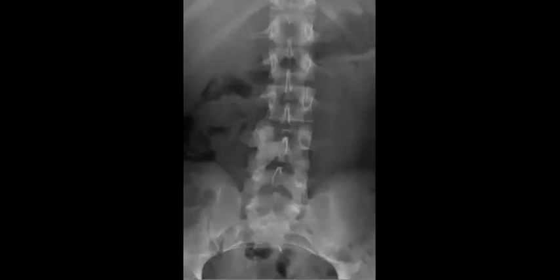Most of the lesions are in the posterior neural arch or posterior elements. So when you see scoliosis and you find this sclerosis, it gives you a clue to think about osteoid osteoma or osteoblastoma.